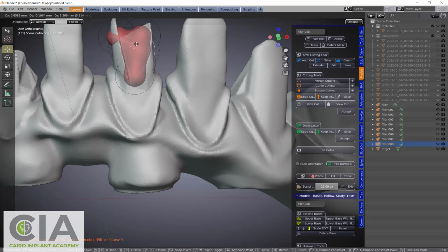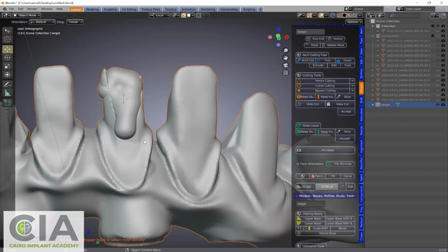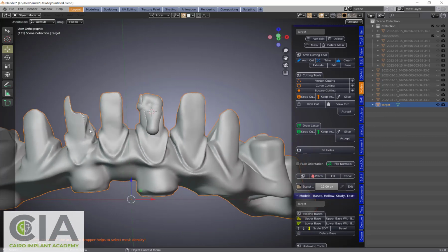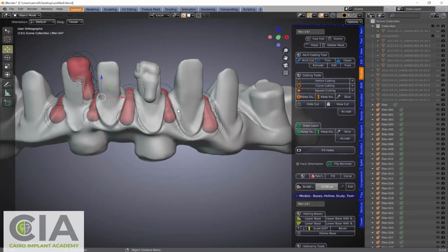So this is here. Okay, and again like this. Then I can just press fill, and this is the correction. I can do this same way right here. Now I have filled the rest of the parts.